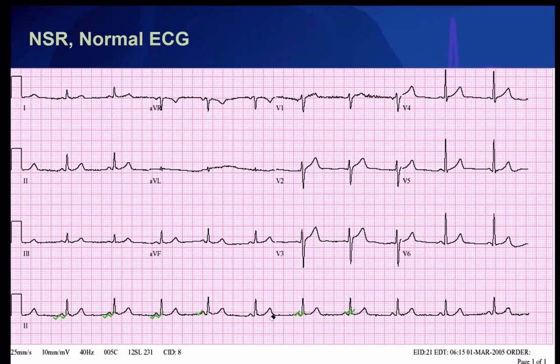What do we mean by R wave progression? You will see so many ECGs in which it is called poor R wave progression. We look at the R in V1 and we measure the R in V2, and you can see it start to grow, and it is growing more in V3. And it grows to its maximum maybe in V4 or V5 or V6. So this is called normal R wave progression.